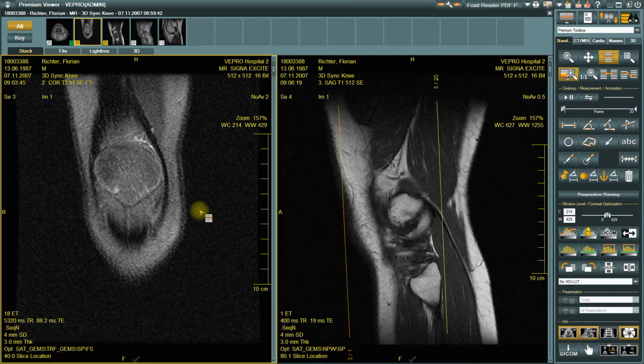later displayed straight away. You can mark the displayed image directly, in the bottom middle, by clicking on the tick, which will then turn green. Marking it like this will turn it into a key image. By clicking again, you can also unmark it again.